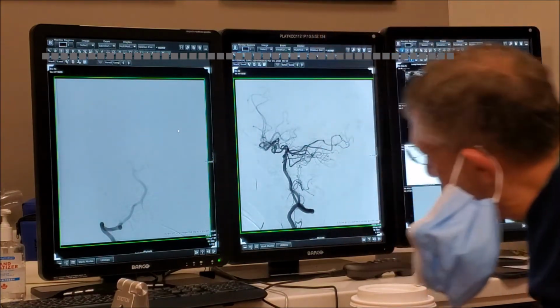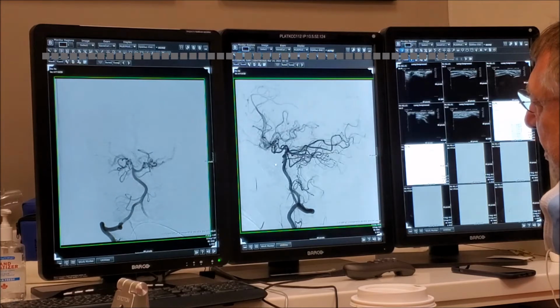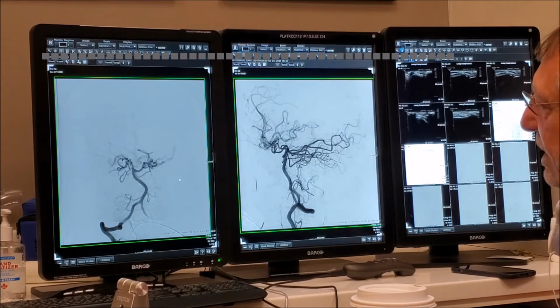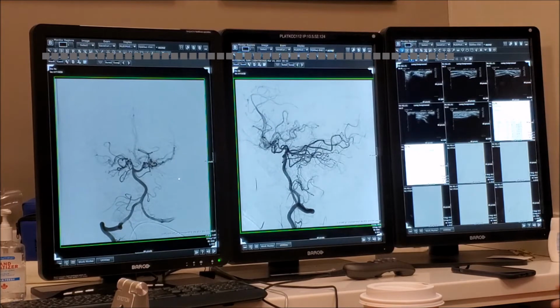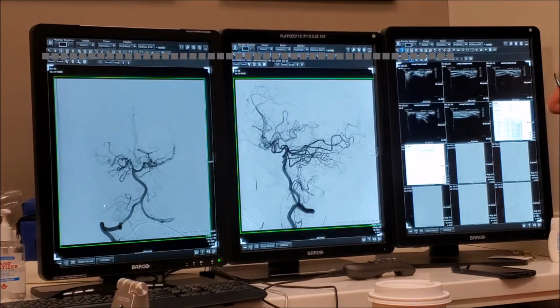So let's try to. We're faced with something in front of our eyes, and we need to be able to tell every single line here what it is, right? Okay, so we're going to come down below here. Could you tell me anything about this? So this is probably a muscular branch. Remember that the arteries follow the nerves. The muscles happen to be there. They're not really muscular. That's a big mistake. Of course they're in the muscle, but there are spaces. This machine unfortunately cannot give you bone, but we'll get to it.